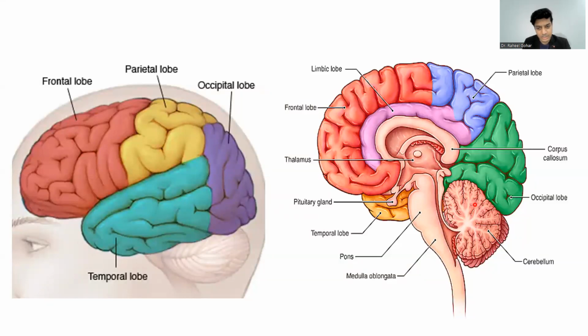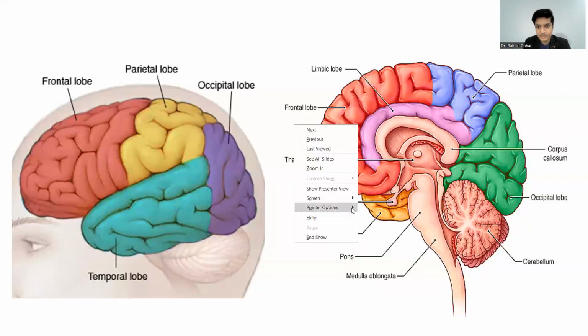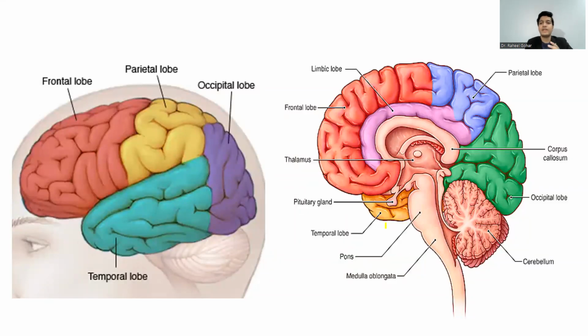Now let's show you something very very important here. Whenever we see the CT scan brain plane, the images are usually in axial sections. So when we are seeing the axial sections, they start from here. So there will be one axial section from here. Initially we will only see the maxillary sinus and the cerebellum, no other structure. Then there will be sections from here where you will see anteriorly the eyes, then the temporal lobe, and posteriorly we will see the brainstem and the cerebellum.